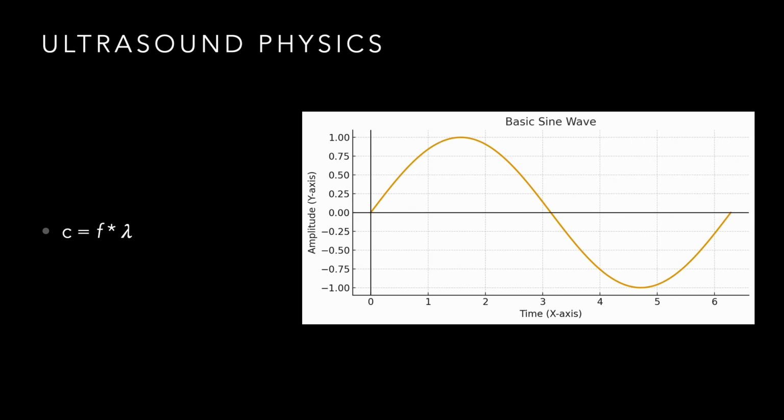And so just for further clarification, 1 hertz is 1 cycle per second. So going from the very far left on this screen, where it starts at the baseline and goes all the way up, goes all the way down and comes back to the baseline. So it's going to cross the baseline twice, right, is 1 cycle. It goes up, down, back up, 1 cycle.